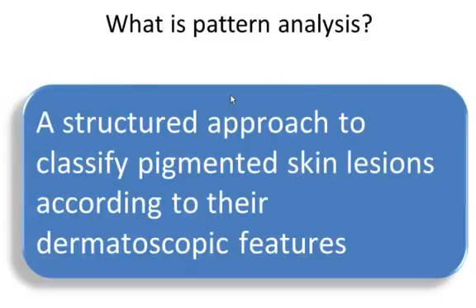I believe that there is a better way to describe lesions with dermatoscopy, and this way is pattern analysis. What is pattern analysis? It is a structured approach to classify pigmented skin lesions according to their dermatoscopic features. It avoids inconsistent terminology, it avoids metaphoric language, and it avoids terminology that depends on diagnosis.